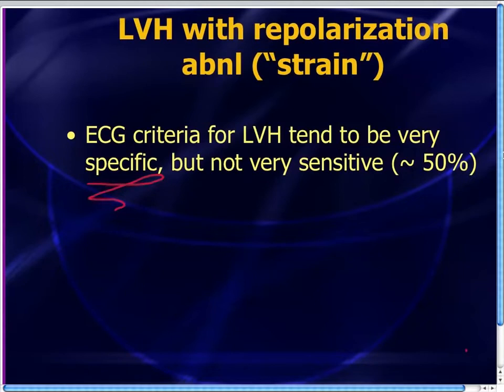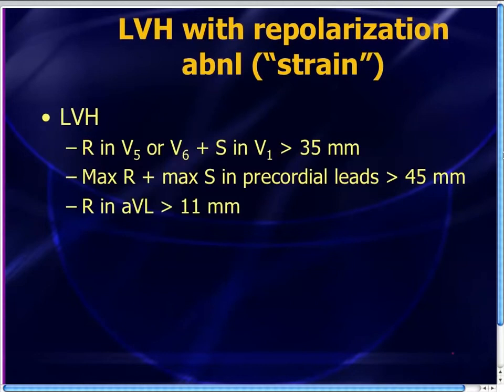But the problem is that when somebody has left ventricular hypertrophy, the EKG can look a whole heck of a lot like a true STEMI. And in fact, probably the most common misdiagnosis over and undercall of STEMI is because of LVH. So you need to know the criteria for LVH, and we're going to go through those criteria here. It's a painful thing, but also I mentioned there's a lot of different criteria that people have put forth. These are the criteria that I like to remember because they're relatively simple.